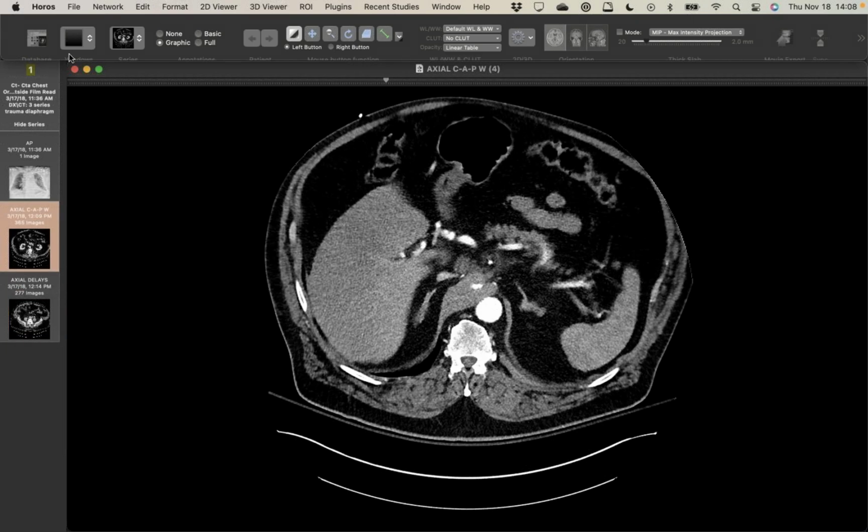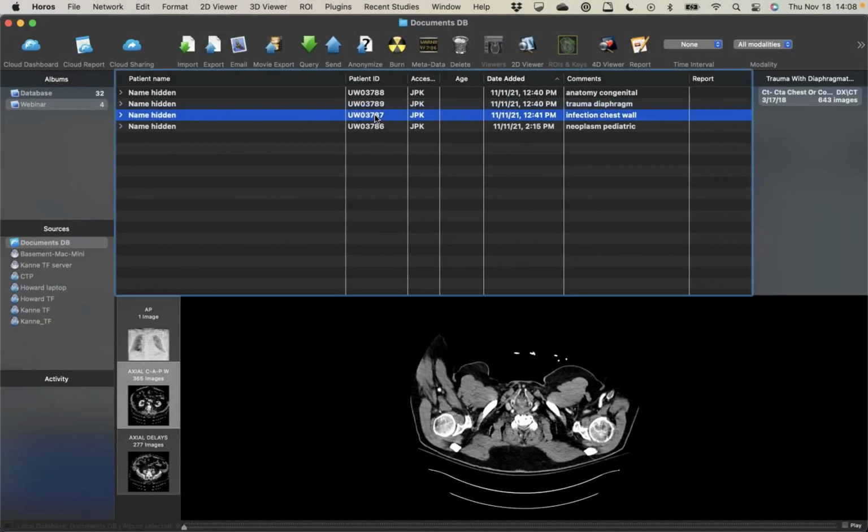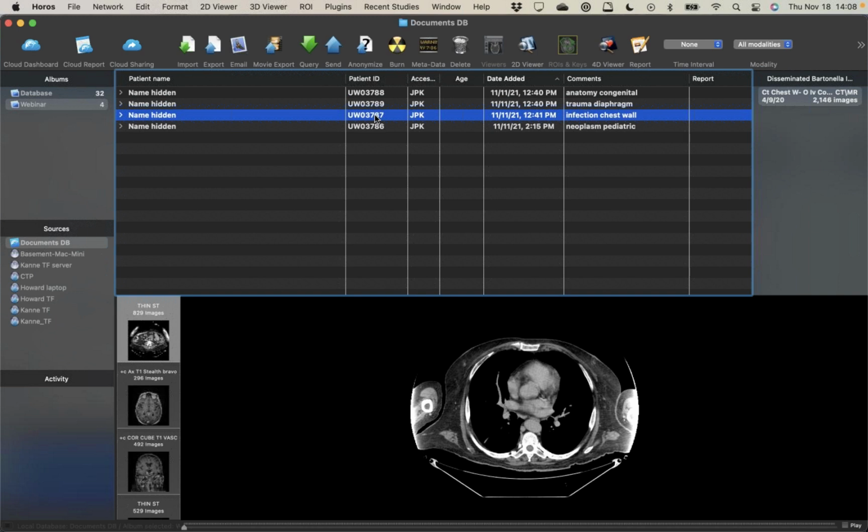So that's that case. That's fascinating. Yeah, so you've got to remember to look down there because it's often at the border, especially if you're in a subspecialty practice where you split up everything. So that's where we overlap with the abdomen, but the diaphragm, in my opinion, is part of the chest. So I take responsibility for it.